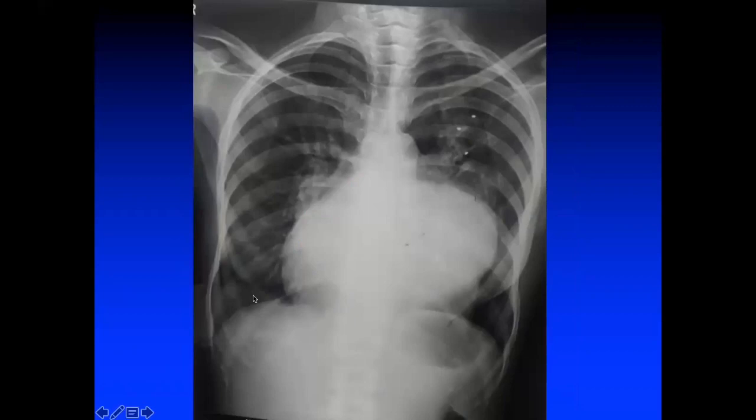Again, a very important X-ray. You can see here the left atrium has enlarged towards the left side, it has enlarged towards the right side. You can see a double atrial shadow. You can see the widening of the carina. You can see a wide-spaced carinal angle. You can have a left main bronchus which is elevated. So this was again a case of aneurysmal left atrium seen in case of severe mitral regurgitation.